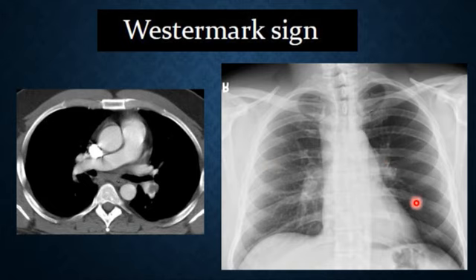Here there is a paucity of vessels, decreased vessels. And when they did the CT scan, you can see this embolism within the pulmonary artery. Of course, you will not diagnose a subsegmental embolus. I'm talking about the more major ones.